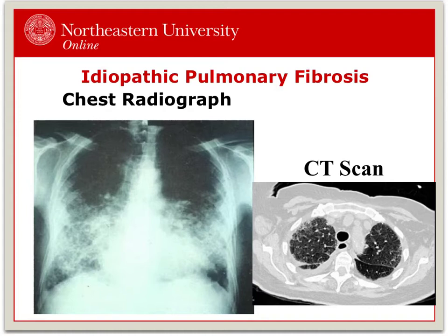Image 1 is a PA radiograph that demonstrates the diffuse scarring. The amount denotes the severity. Note the difference in the image appearance from the small airways disease compared to the previously seen images for the large airway pathology.